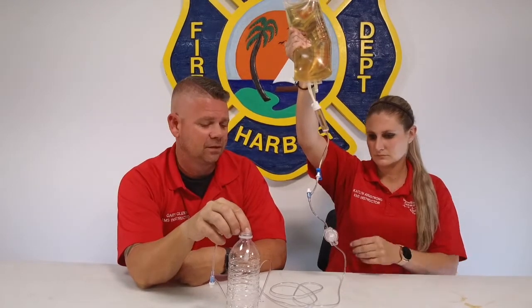So now what she's going to do is she's going to go ahead and take the set that we have and hook up the IV line, and then she's going to go ahead and flush this out. Okay, and as you can see, we actually added some food coloring or some dye to the medication so that you guys could see it in the bag, because Levophed should not be brown, just so you guys know. This is for demonstration purposes only. Okay, so Caitlin's flushing out the line right now. This is a mini drip or 60 drop set, so it's going to take a few minutes for it to get through the system.